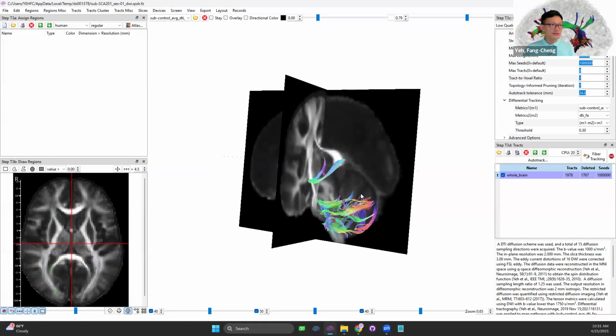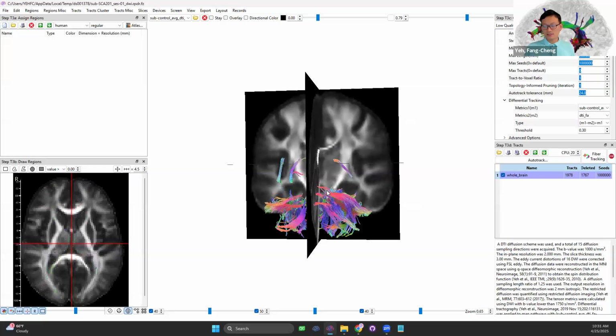Once you get some results, do the same in the control and calculate the FDR. Then you will have a quantification of how reliable your finding is.